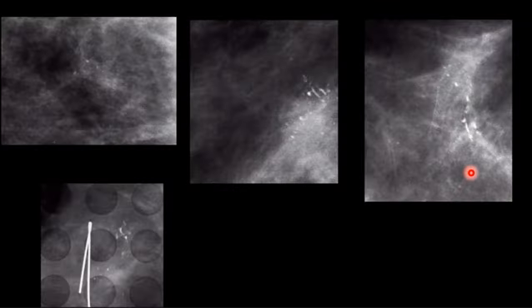Another example. This is a ductal carcinoma in situ, high grade with central necrosis. This was the MLO, oblique spot compression view, demonstrating punctate calcifications. I think you can see it here and here. It's punctate, it's focal, it's a little bit pleomorphic. They are somehow different shapes, okay?